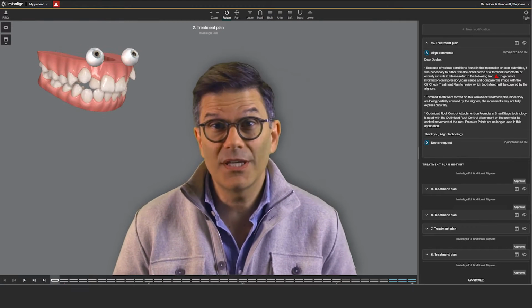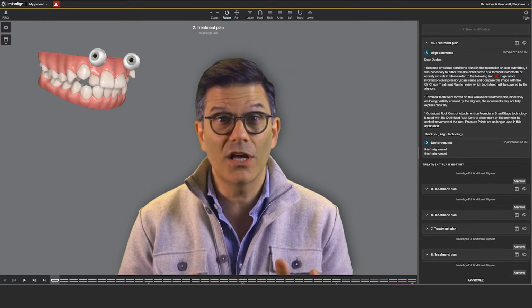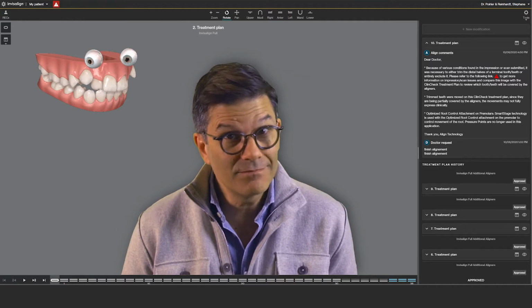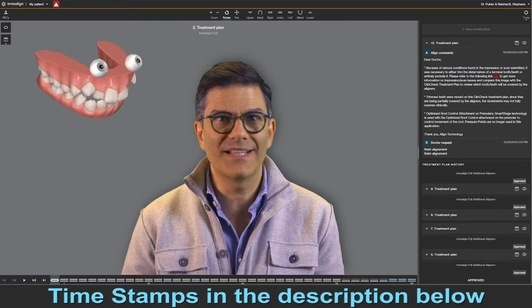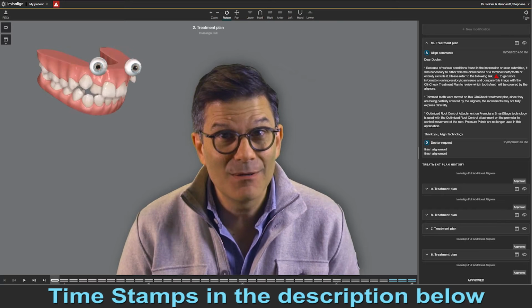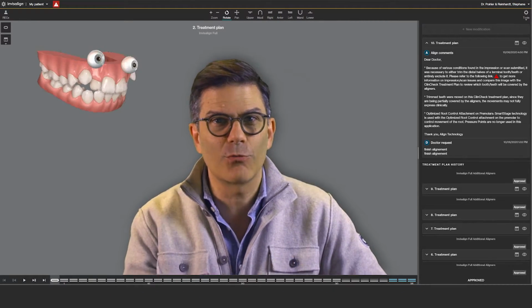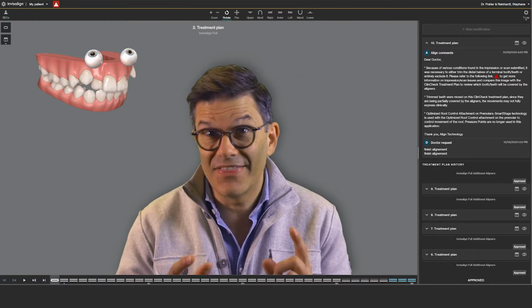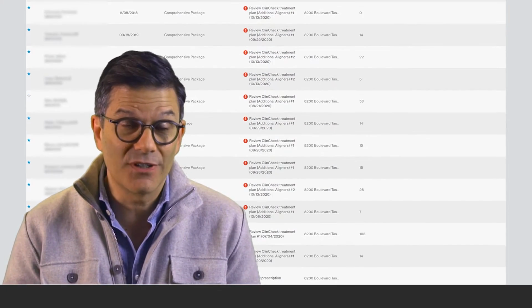I had the pleasure to be a beta tester for this new version of the software, and there was a lot of work put into this, and we can say that Align delivered. In this video, I will guide you through the whole platform, tell you about what is new, what has changed, what is still the same, but stay till the end where I will show you the most incredible new tool they added.